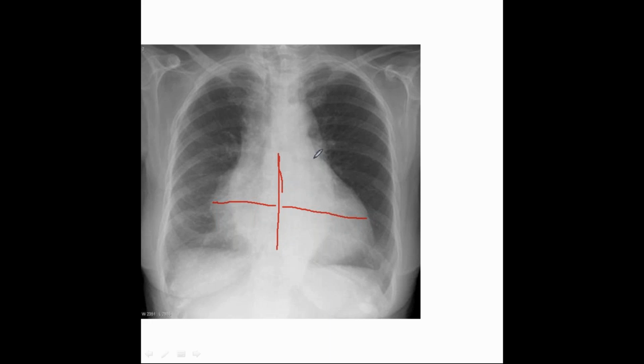Why do we have two shadow borders of the heart? Yeah, you are asking about this. So yeah, this could be a possibility. I'll show you another X-ray. Don't worry.